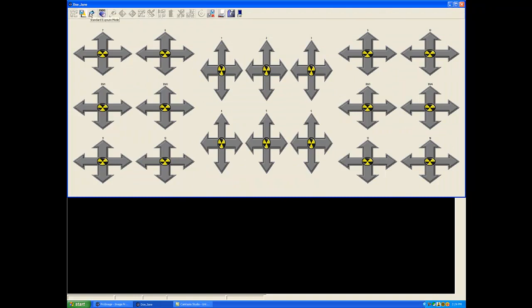We have the standard mode, which is for taking a sequence of teeth, and we have what's called the endo mode, which is for taking basically root canal therapy, but it doesn't have to be restricted to the use of one tooth. You can actually choose or move the sensor to different teeth because you have the ability to drag and drop images from one location to another.